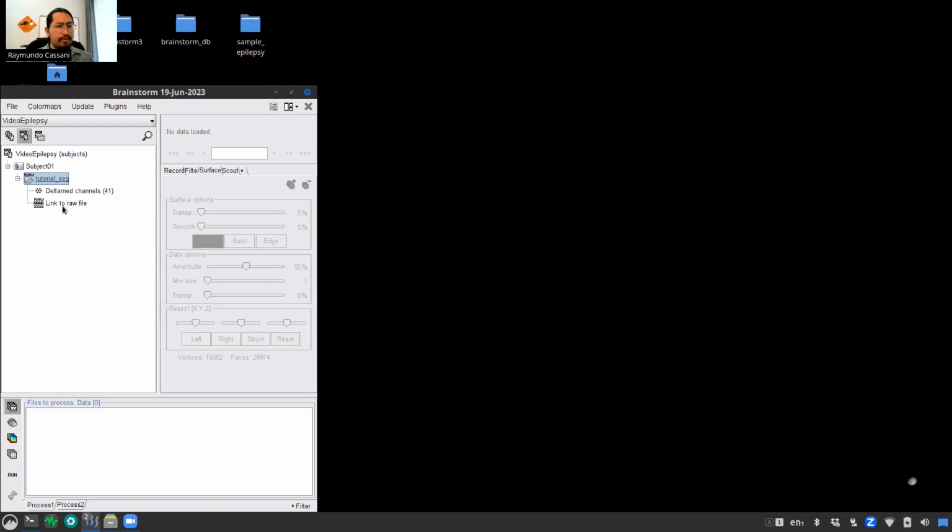Now this will create a link to the raw data. It's important to know that it's a link, therefore our raw data is not modified. So first, let's just explore the channels that we have in the data with right click in the channel file. And we do edit channel file.